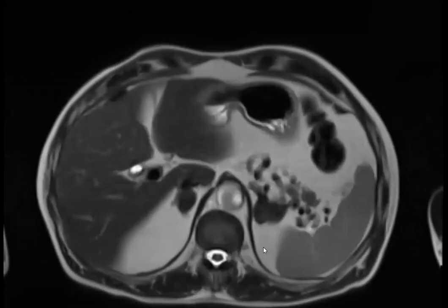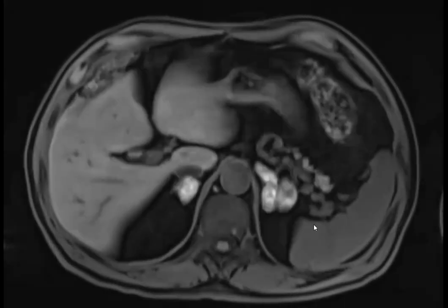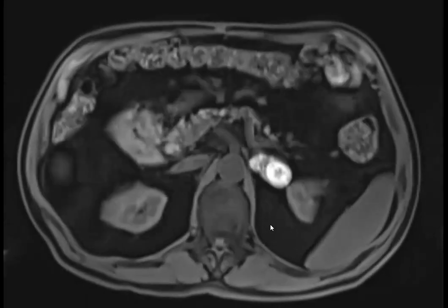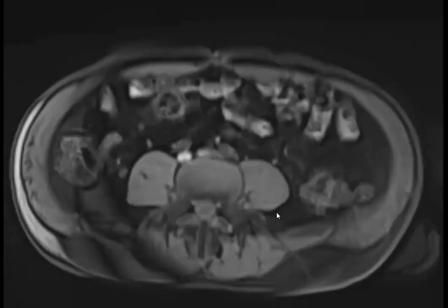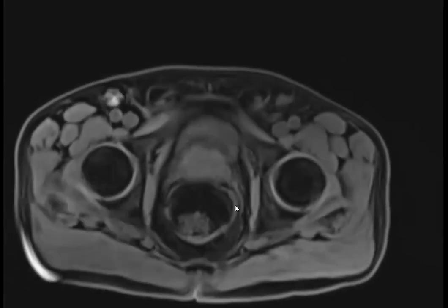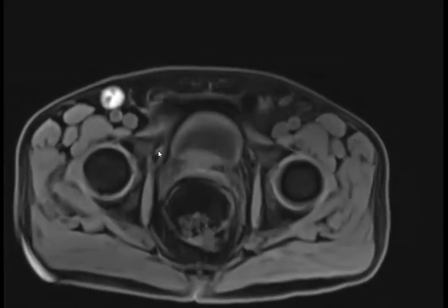Is there a diffusion weighted? Yep. But it's kind of a trick question because you would have looked at the sequence. What I wanted you to say is the pre-contrast. So this is the pre-T1. I showed you the venous phase and they looked really bright, but now I'm going to show you the pre, and you can see that they're also really bright here. There's lots of little bright stuff all over the place.